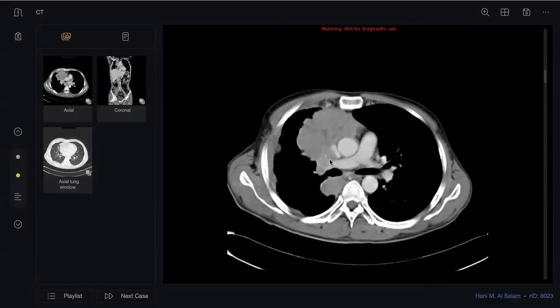My final diagnosis is that it's an invasive thymoma with pleural seedings into the right pleura. So this is most likely a stage 4. I would inform the referring clinician and fast track the referral of this patient to oncology MDT for further management. The patient should also have an urgent abdominopelvic CT. I think it was already done alongside this imaging, so I would review the abdominopelvic CT for complete staging of this patient.